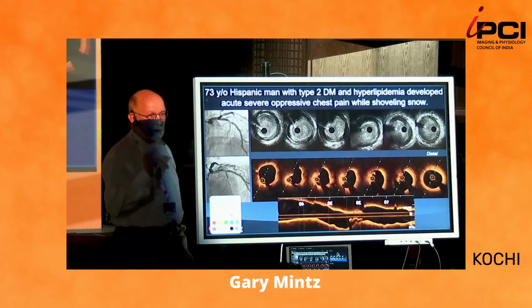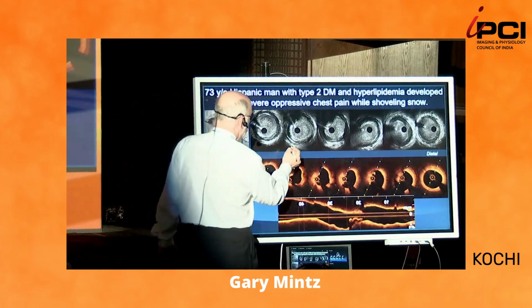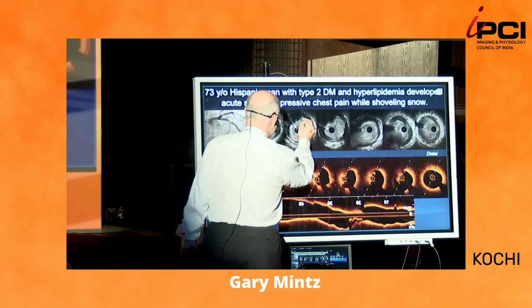Every so often, we will see it by IVUS. And here's an example. And if you look very closely, first of all, the plaque burden is modest, right?